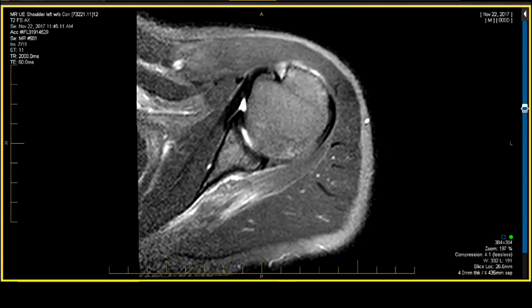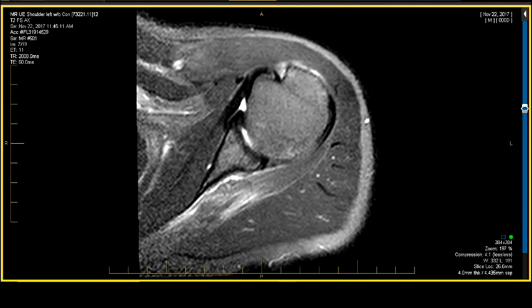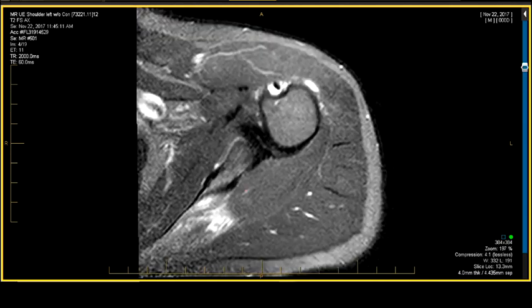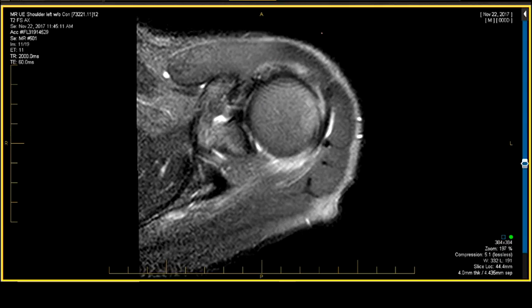Although for an injury to get the entire infraspinatus, you know, that'd be a little unusual unless you can find a focal area of concentrated separation of fibers. And maybe that's it right there. Did have an injury after lifting lumber, so that wouldn't be unreasonable. Let's keep going, shall we?